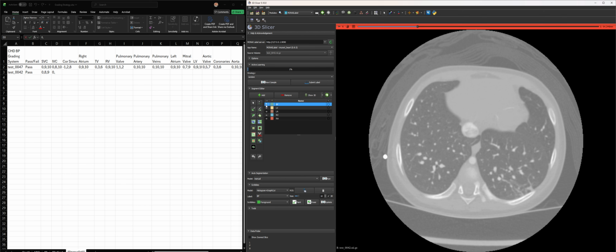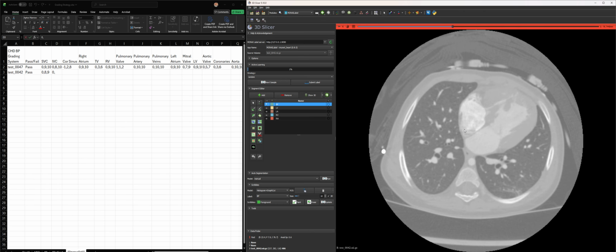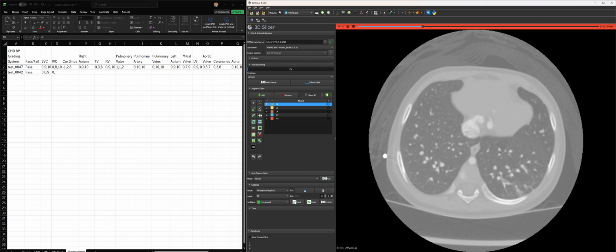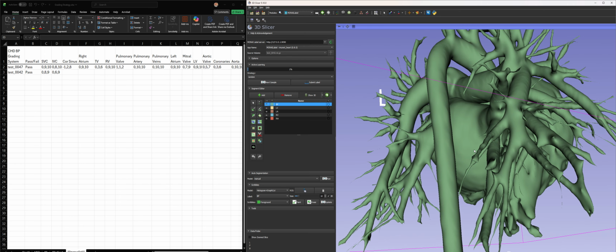This could be hard to look at to define the structures because of the swirling of the contrast in it. I'm going to give it a potential of 9 and an actual of maybe like a 6. So 0, 6, 9. Coronary sinus. Now, coronary sinus in the pediatric cases also is usually not as prevalent.